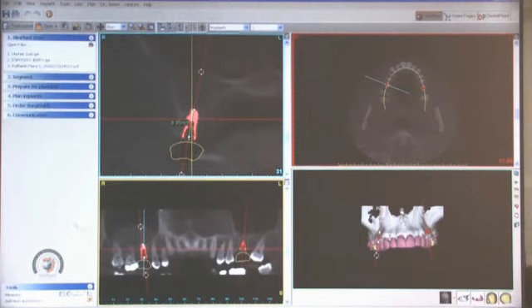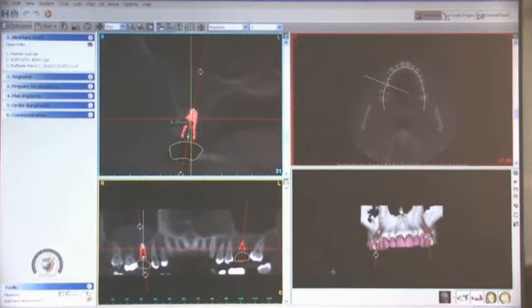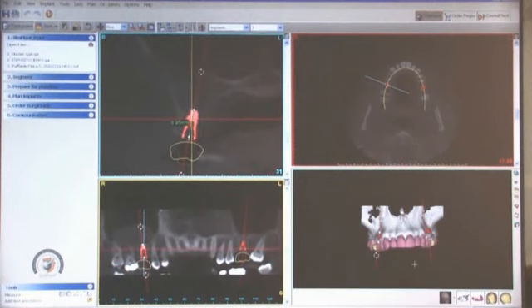So just to walk through the screens real quickly for those people listening that aren't familiar with the software, this is SimPlant, and the implant that you requested is Cybron, and I believe that your request was you're going to put Octa on one side and a Hex on another, just for educational purposes to show the differences in how you take impressions, but the implants themselves will be identical. Correct.